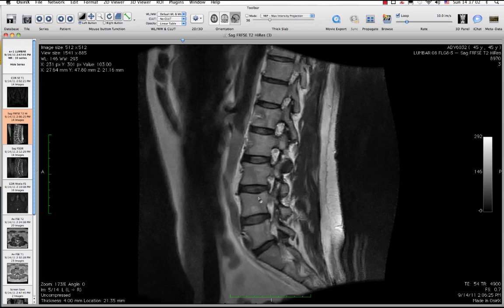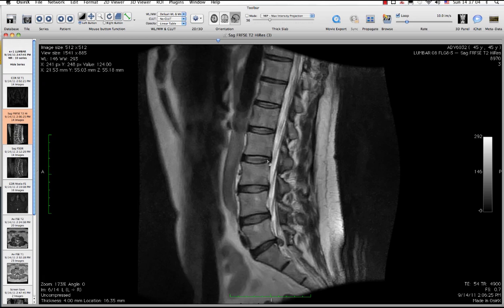Alright, one more click in, and here, this white area here, and you can see some dark stripes in there. Those dark stripy things are the lumbar spinal nerves. The spinal cord terminates up, it's really outside of the picture here. And then the nerves come down in the neural canal. And this white stuff in here is actually cerebral spinal fluid.